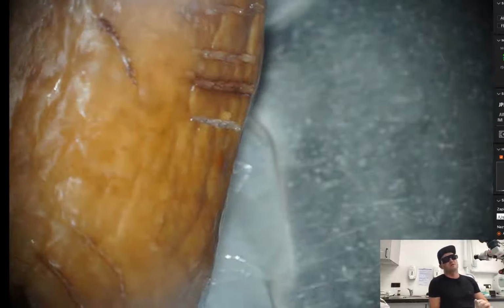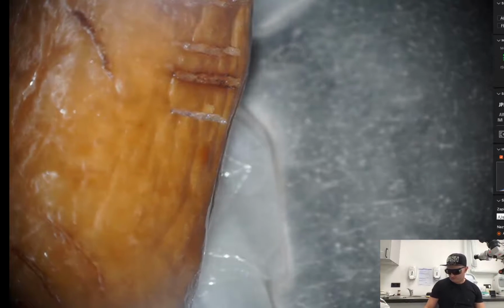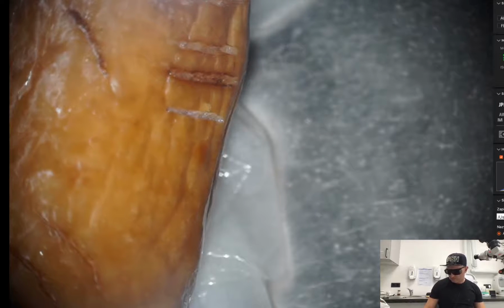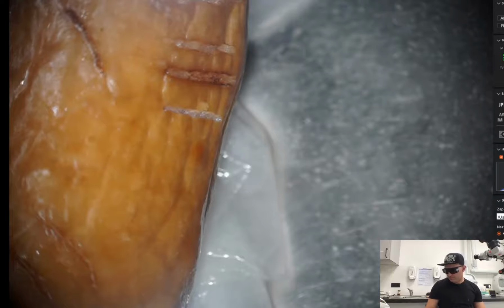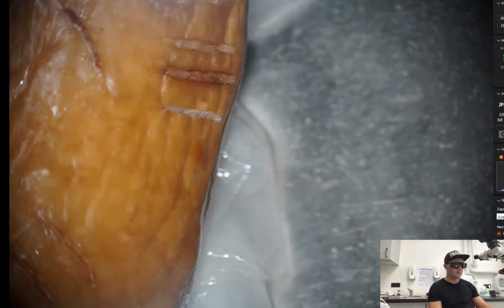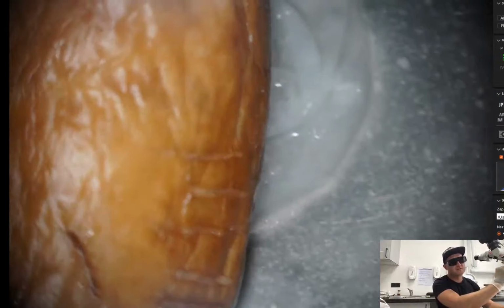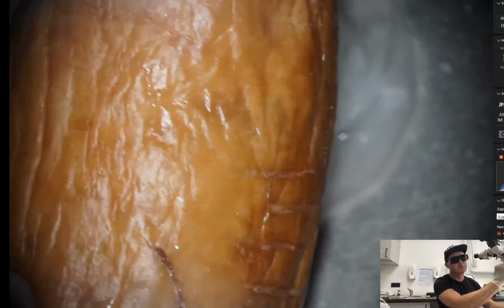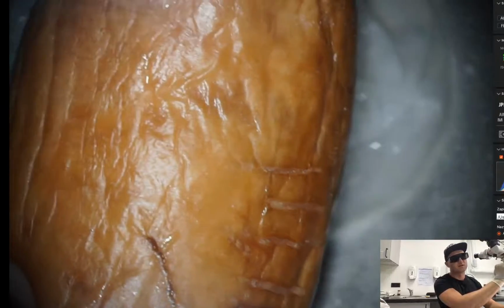So this is what changes when we adjust our parameters. Now I will show you the same energy but given 12 times slower. So this is the first cut we performed with 10 Hz.